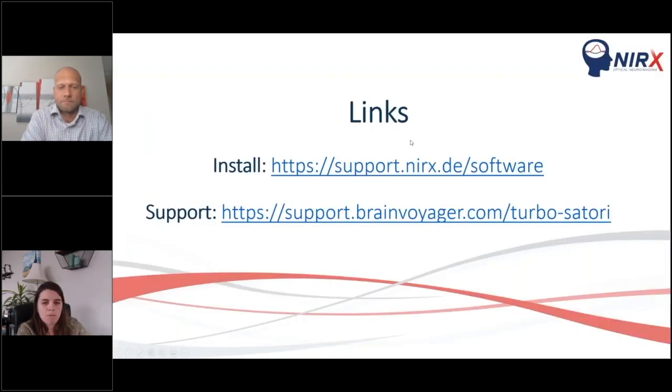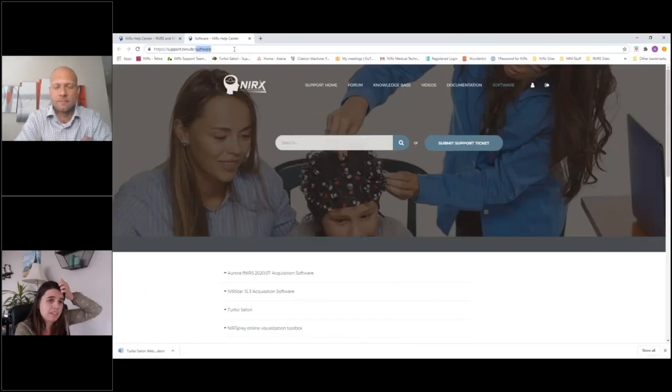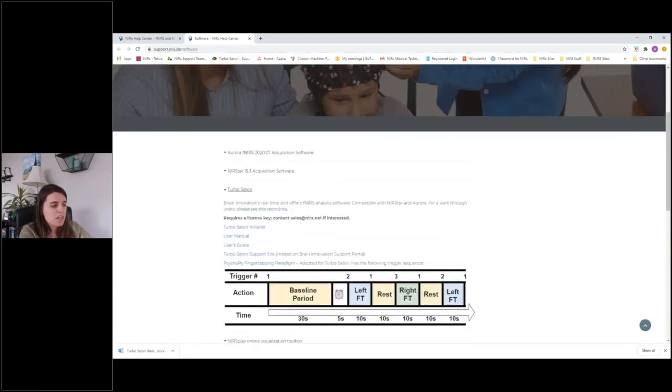Okay, I want to follow. So here are two links for installing and then Brain Innovation support. So I want to follow this link and we'll have a look at the installer. So we're here on the NIRx support site. If you're not familiar, the NIRx support site, the hyperlink is support.nirx.de. I'm on the software page just by clicking up here to this navigation portal and coming down to Turbo Satori. So this is where you'll find the installer for Turbo Satori. Just click it right here.